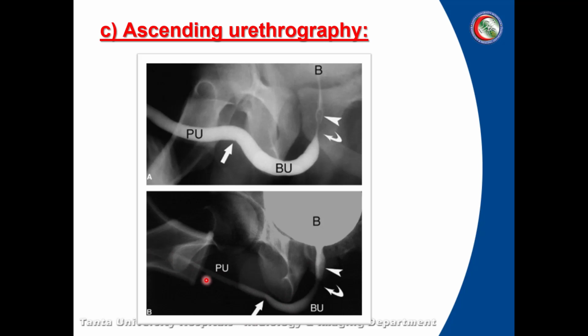including strictures, filling defects, any abnormal soft tissue lesions, and also if there are abnormalities in the bladder neck, such as prostatic enlargement or prostatic hyperplasia or prostatic carcinoma.